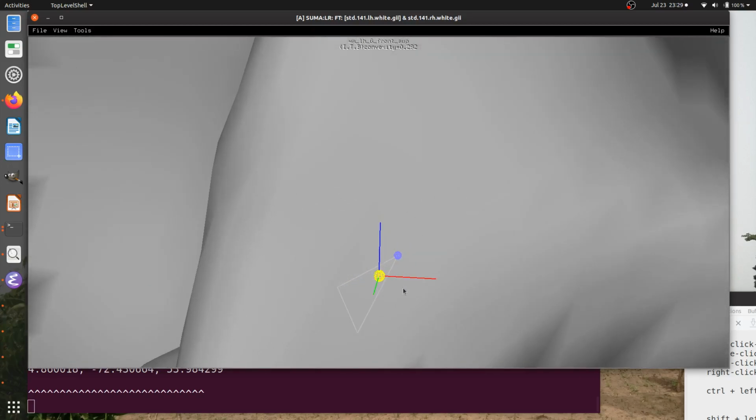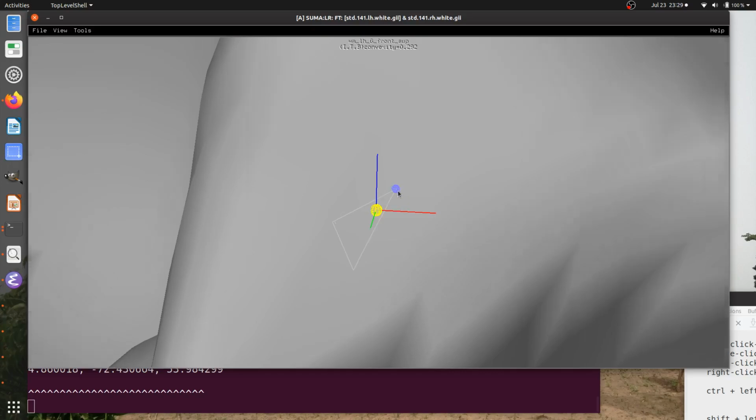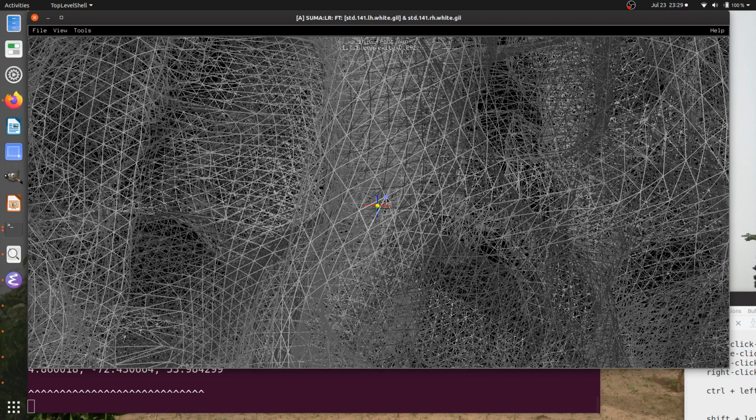Okay, and then in AFNI land, when we think about a voxel having neighbors, we can talk about NN equals 1, 2, 3, sharing faces, edges, or nodes, or some form like that. What defines a neighborhood or a neighbor in SUMA? Well, the direct neighbors of this node are all the other nodes that share an edge.